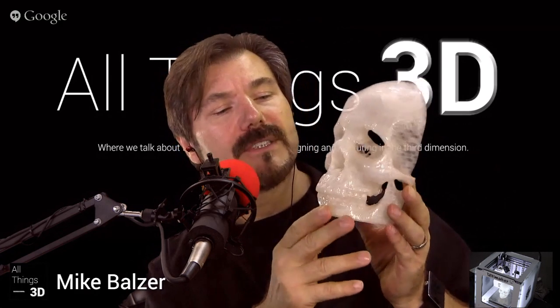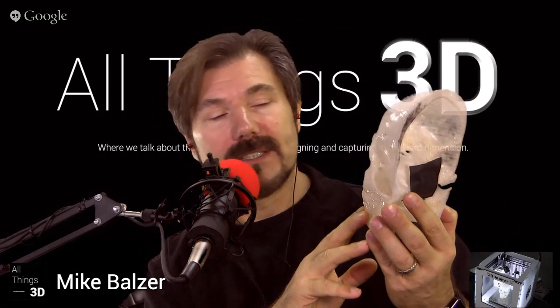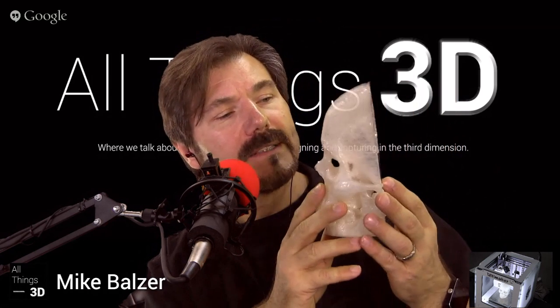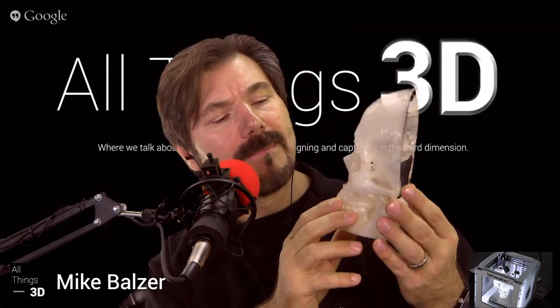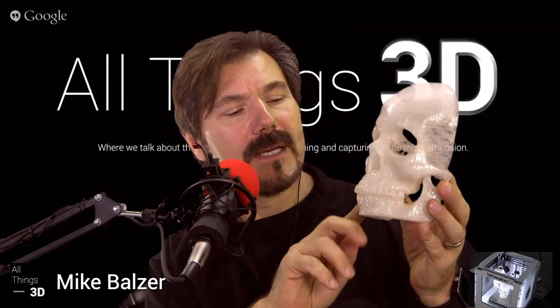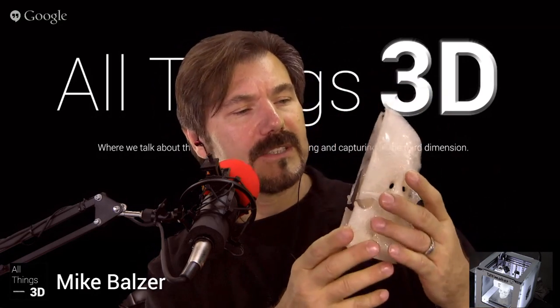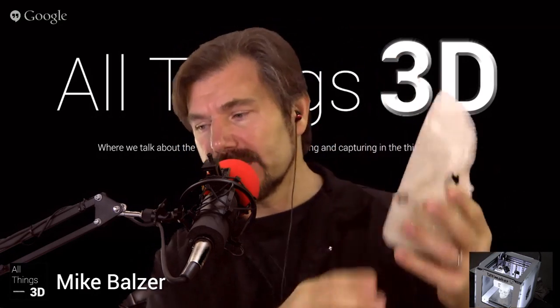Much better definition. I think part of the reason that it had better definition is that the Roentgens that were used were higher. I also noticed there was some flaring in the teeth. And maybe Jevin can explain that to me a little bit later, why you see that. But this was another model created.